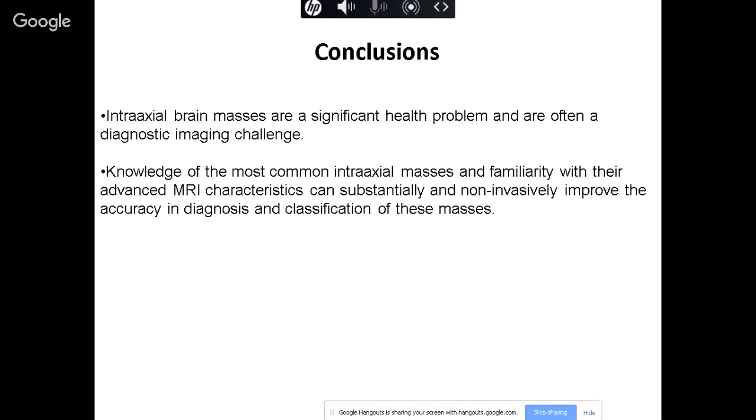Because of the earnest effort in neuro-oncology, I want to give a lot of talks on tumor topics. So next time, I'll let you feel more comfortable looking at imaging. Why is this mets? Remember, one third of brain lesions are mets. Supratentorial, infratentorial, you always think about mets until you prove otherwise. But looking at this sometimes is important. Why? Because management is different. So you need to look at the tumor mimickers. The giant aneurysm could mimic the tumor. And this is much more fun than waiting for the biopsies to come out.